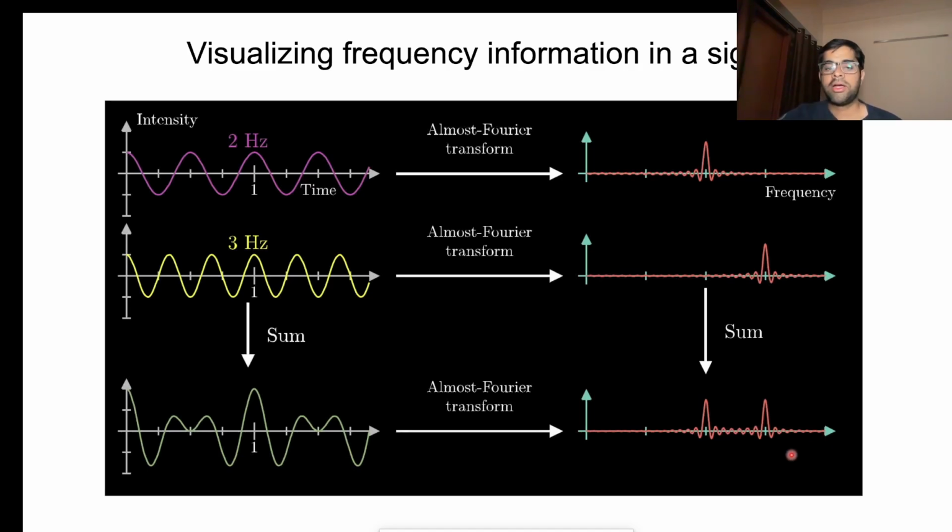And second one, you see many peaks here but not here. So basically it's the same signal but the information that you're seeing is different. In the time domain, frequency is how fast the signal is fluctuating. So the more fluctuations you have, the peak will go to higher frequencies.